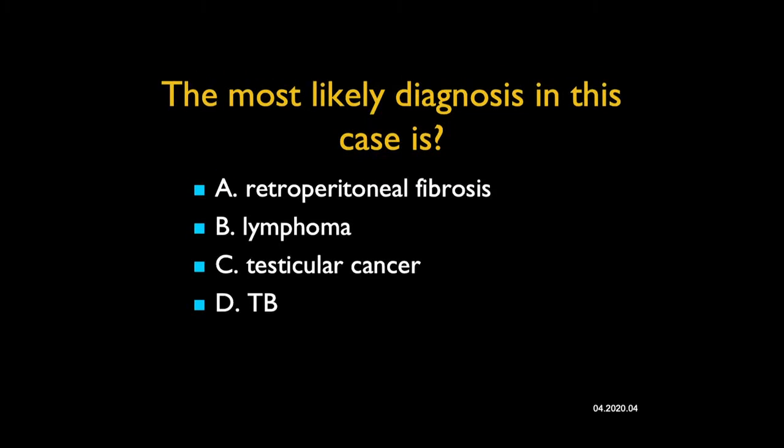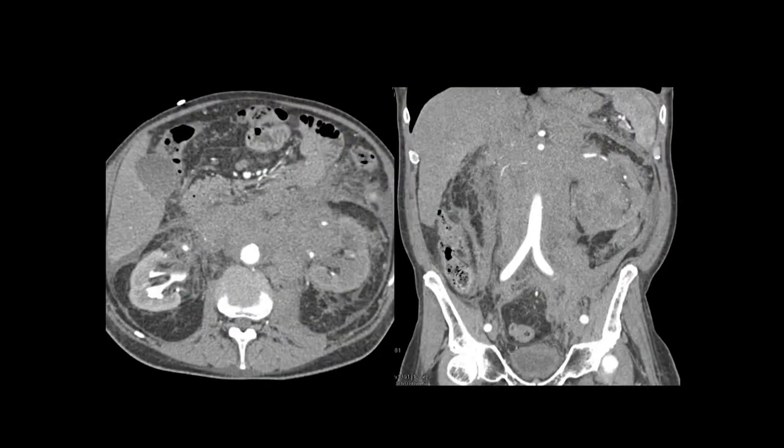The most likely diagnosis in this case, this is a beautiful case, very impressive. Something's infiltrating the left kidney. There's also extensive tumor in the paraaortic and in the mesenteric region, and also extending by the right kidney and down by the psoas on the left side. Testicular tumor can give large masses, but typically they obstruct the kidney and they're often cystic. TB can infiltrate with nodes, but in the kidney it tends to be calcification. In a shrunken kidney, TB just doesn't look like this.